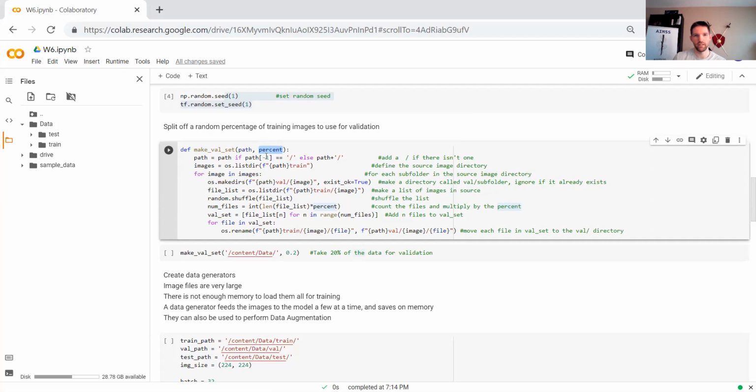So this is the index, which means the way counting works in Python, you count with 0, 1, 2, 3, 4. But -1 kind of loops back around. So if you're at 0, -1 will be over here, -2, -3. So this is saying -1 of path, which will be the very last character in path.